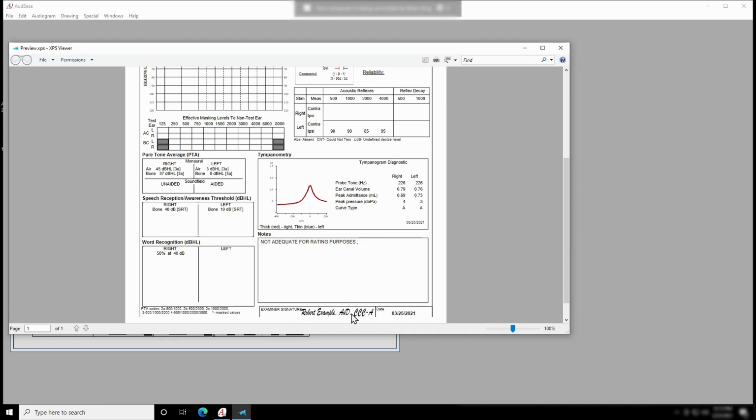If one of our standard reports doesn't meet your needs, you have an audiogram you've been using for years and are attached to, or you have an idea in mind for your perfect audiogram, we do offer completely customized reports for an additional fee.